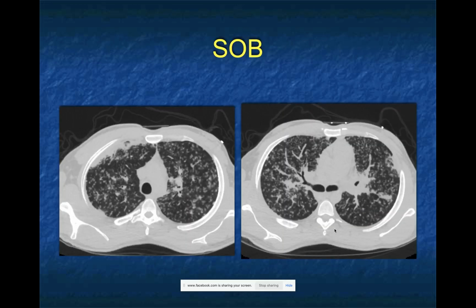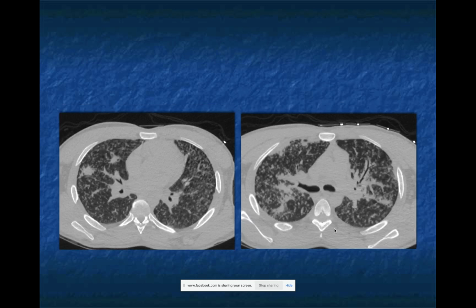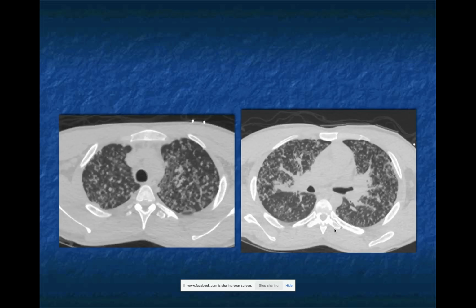Another case, patient short of breath, and when you look at this case, what do you see? Well, the main thing you see are these multiple small nodules which fill in the alveoli, and it's particularly impressive. We're looking at the upper lung zones. There's also some extension of this along the fissure, and all these little tiny nodules are really nicely seen. There's more of a solid nodule in the right upper lobe, but these multiple small nodules present, something that gives you alveolar space filling. You could think about infection, that would be a thought.